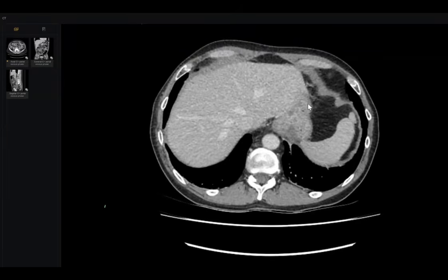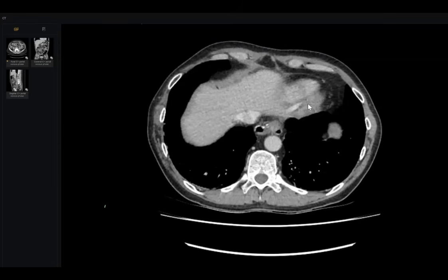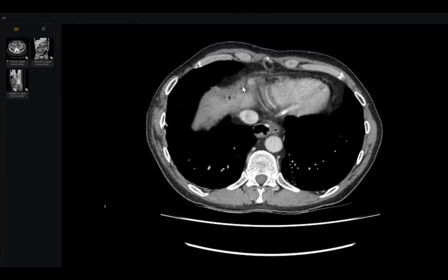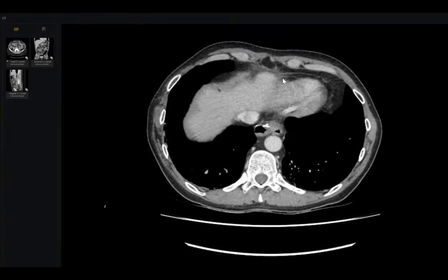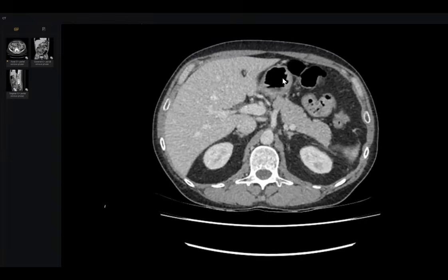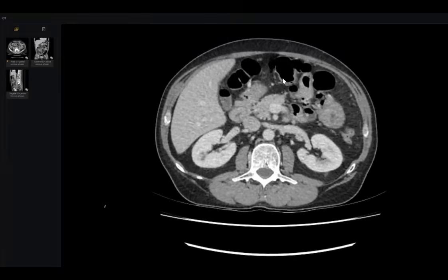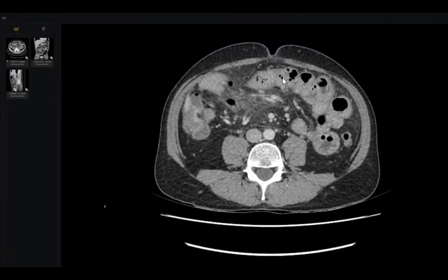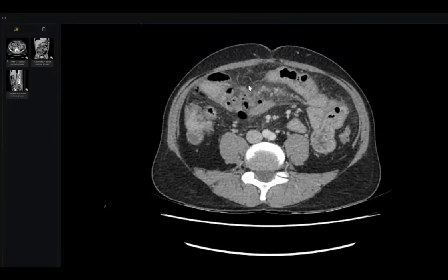Very important. This is the key. This is the most important thing here. There are foci. If you pick this up from the beginning, it will be very easy. What happens in, doctor, I'm searching grossly, and I find something abnormal here.